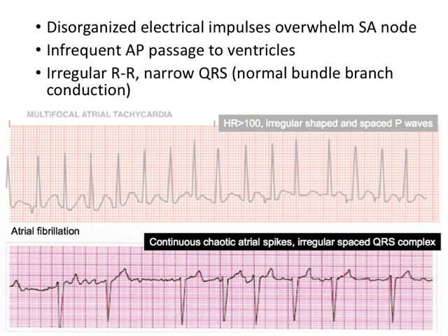But if we have a nice, quick, short, thin QRS complex, that means that transmission once you get to the AV node is normal. If this were elongated and wider, transmission through the AV node or the bundle branches would be somehow impeded.